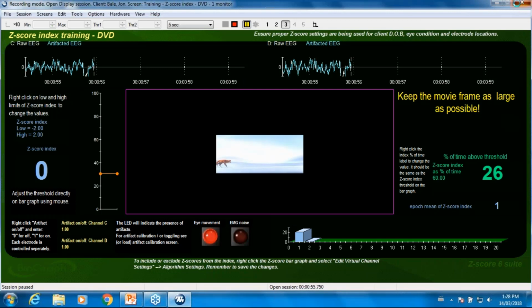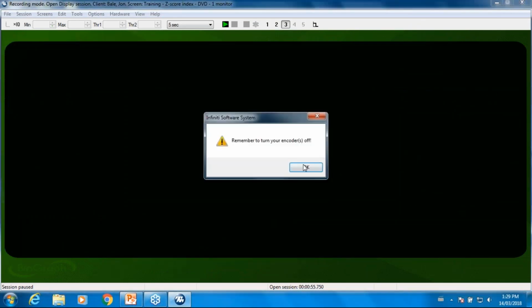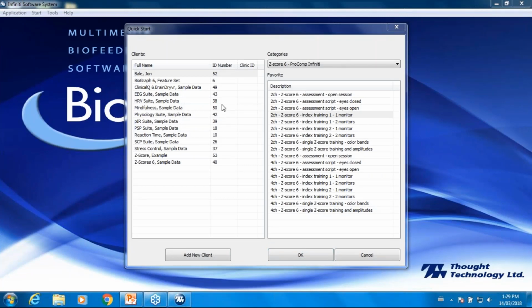All right. Let's have a look now at what training would be if you only looked at a single statistic. Someone's asking a very good question of how do you decide what sites of the head you choose to assess if you don't have some other system of doing that? You would have to choose the sites yourself based on priorities related to the individual's condition.